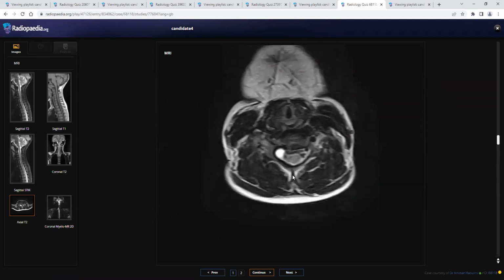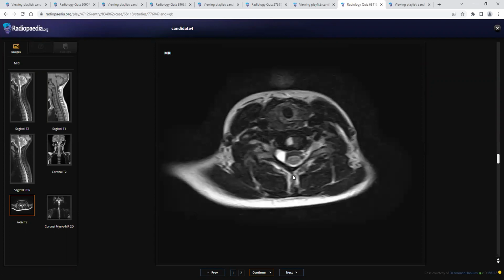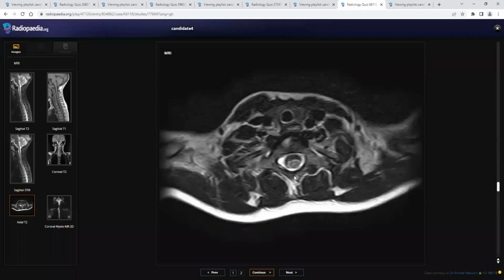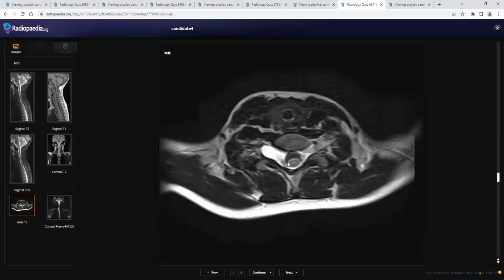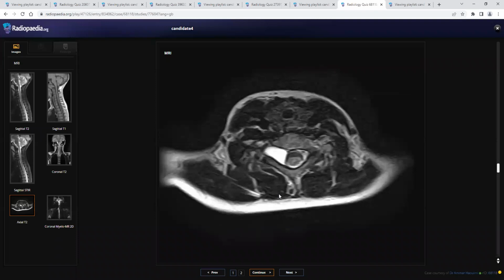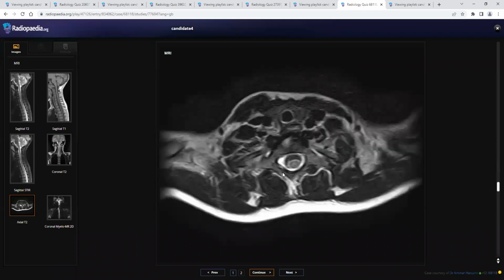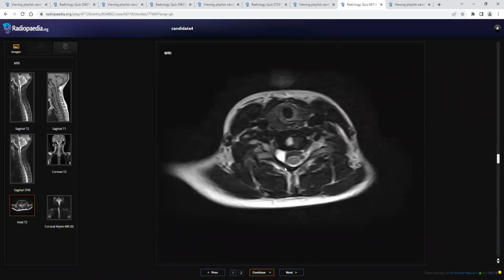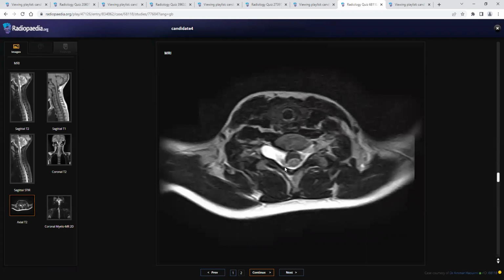So it can be a lateral meningocele, lateral thoracic meningocele, and I don't see any obvious cystic lesion over that or any obvious vertebral defect to call it a neuroenteric cyst. Okay.